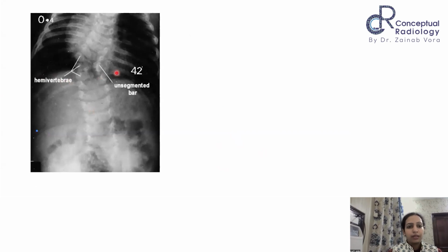Okay. So something like this, when a bar vertebra is coexistent with a hemivertebra. Can you spot all these three? Like this is the 12th rib attaching, so this is a D12. All right, you should count also because they might be having rib abnormalities as well. And also radiographic correlation might be difficult at times. So don't force yourself if you're not able to figure it out. You should try and figure it out in different scans, and maybe CT is a very good modality, I would say.